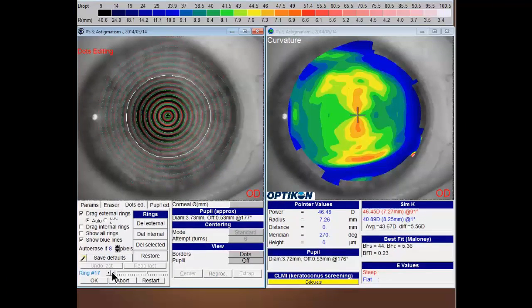You'll see when we get out here we've got a couple little glitches in the surface. Again, some docs don't like to micromanage these little irregularities. I like to kind of fix them as I go, so I go all the way out each mire and just kind of click on them and make a little adjustment for them. This is a nice ring here, and you start losing a little more data as we start getting out closer to the periphery. Once again, you can just drag them through and correct those. I'll fix a couple more here.